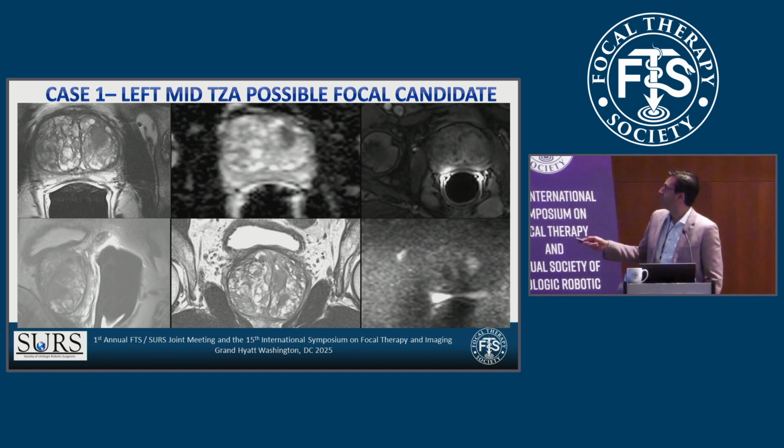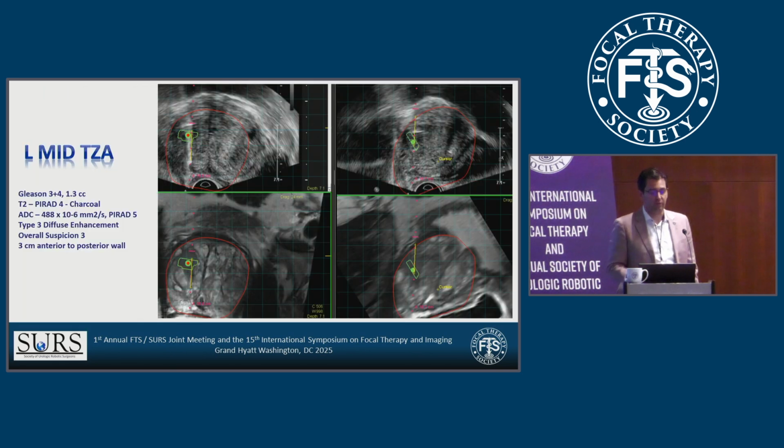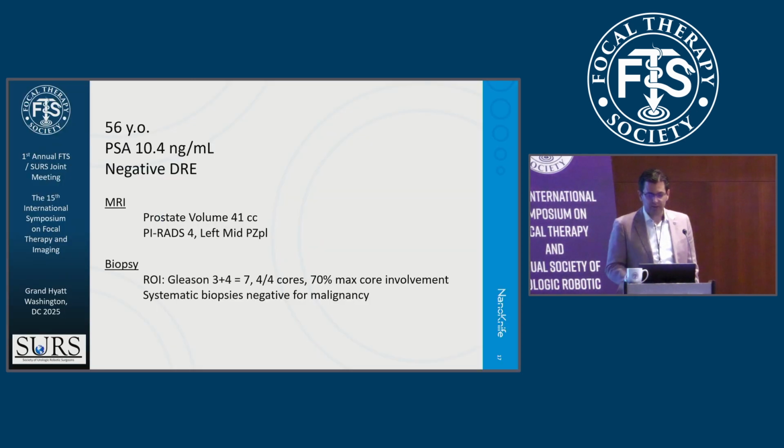So you can see this, it's beautiful. This would be a great focal case. Unfortunately, this was early in my career. We had just started fusion biopsy, so we were able to sample the area as grade group 3 plus 4. Case number 2.